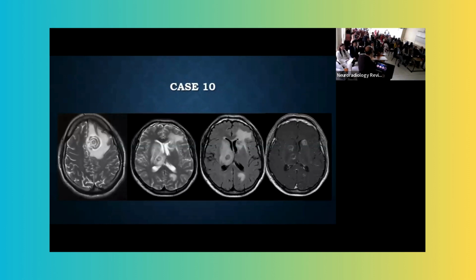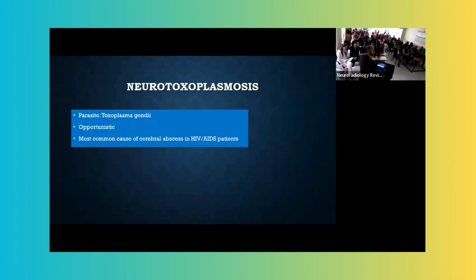What is the diagnosis here? So basal ganglia predominance, and then you see the target sign here, eccentric and double ring sign, okay? So this is seen in toxoplasmosis. Again, immunocompromised patient, opportunistic infection, typical features, and then lots of other differentials because of basal ganglia.